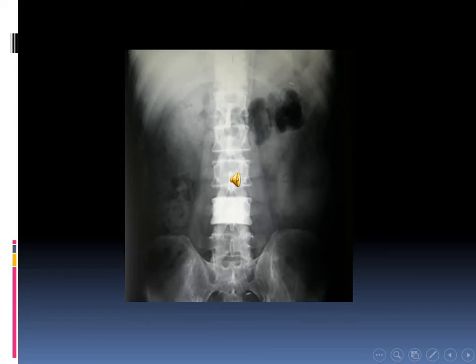So metastasis can appear osteolytic or osteogenic, or it could even be a mix of both. Sometimes a single vertebral body metastasis is seen, which is called ivory vertebra. As seen in this plain X-ray, the single vertebra noted here is a very dense vertebral body. This represents metastasis.